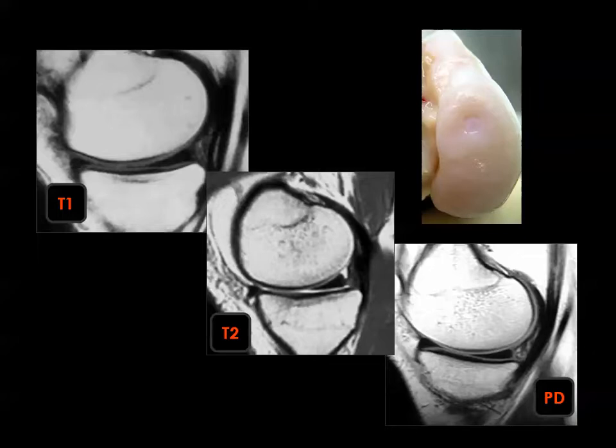Then if you look at the MRI, the T1, the T2, and the proton density image, which is, as I have said, a very important pulse sequence, especially in evaluation of the knee. Then if you don't have fluid, you cannot predict the pulse sequence unless you follow the signal of the fluid or you read the parameters on the fat.